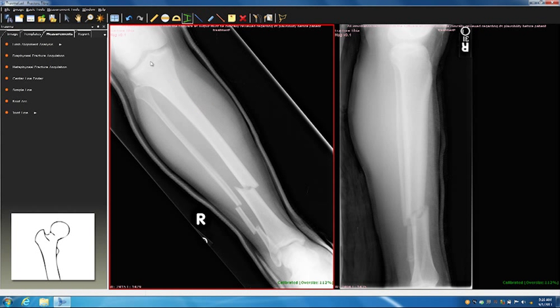An inner line tool, which will allow you to measure angles as well, for like Cobb angles or something like that. So there are many different measurement tools that you can use, just like you could on a regular PAC system. Now where we move away from regular typical things, you have this lasso in the corner. This is called define fragment. Dr. Siddiqui, when he's talking about his things later, uses the define fragment tool a whole lot.